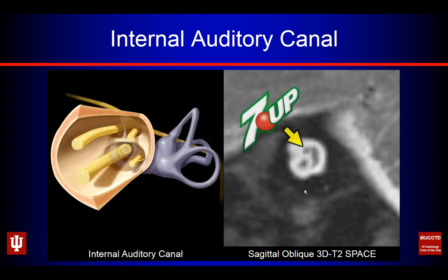Okay, so as we look at this, we've got on the left side is anterior, on the right side is posterior. We know that because we see our cerebellum back here. But we remember 7 up, coke down. So cranial nerve 7, the facial nerve, sits superiorly and anteriorly within the internal auditory canal. So here's our facial nerve. And then we have coke down, so our cochlear nerve sits anteriorly and inferiorly, so here's our big cochlear nerve.